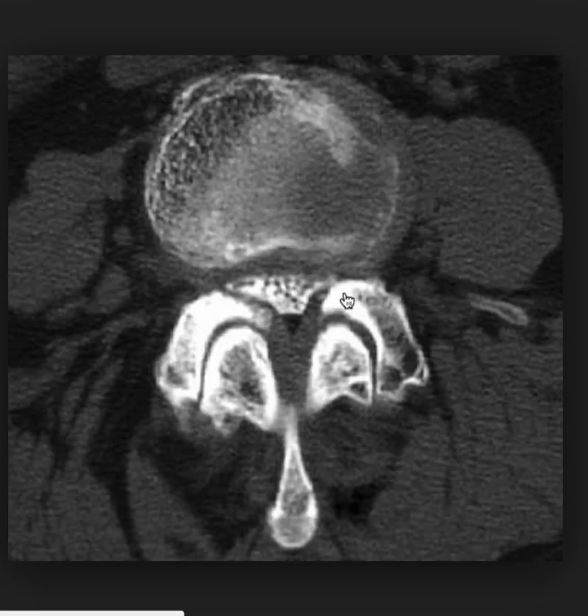If you put a water balloon between the ping pong paddles and then squish them together, they're going to come out the side. So here this white, you can see the cortical ring of the vertebral body here. But outside of that, this right here is the disc. So because you've lost disc height, it's pushing out to the side just like a balloon between ping pong paddles.